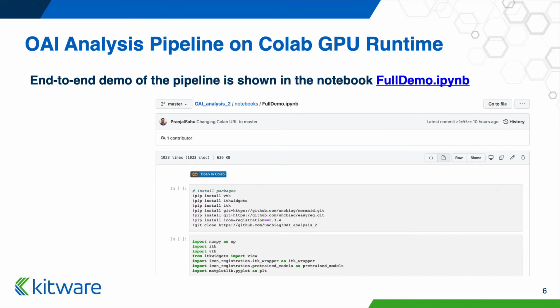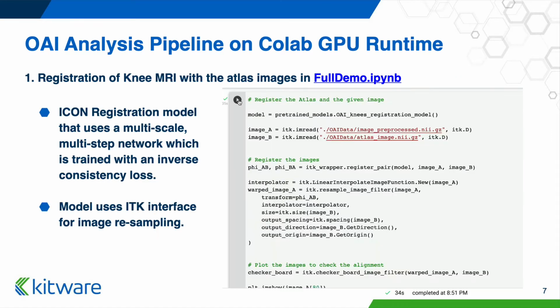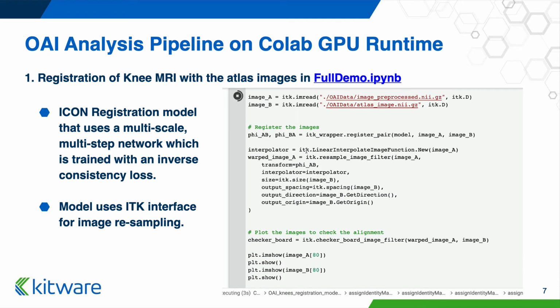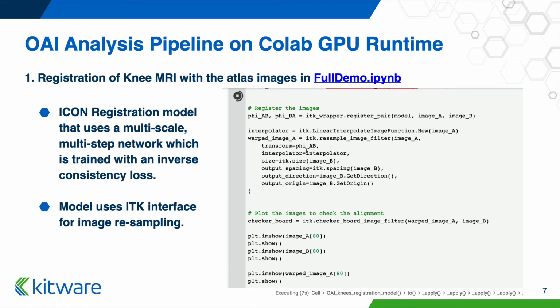An end-to-end demo of the pipeline is shown in a Jupyter notebook named Full Demo. The users can simply open it in a Google Colab and run it step by step. Now, I'll be describing the various steps in this pipeline with the help of the Full Demo notebook.